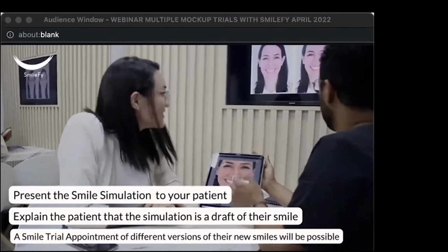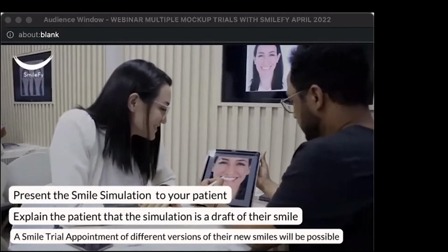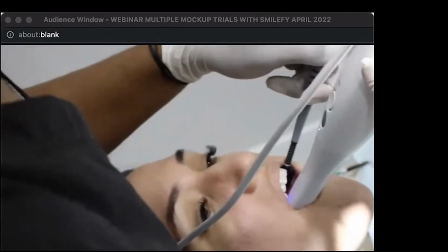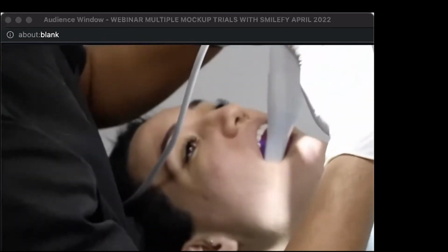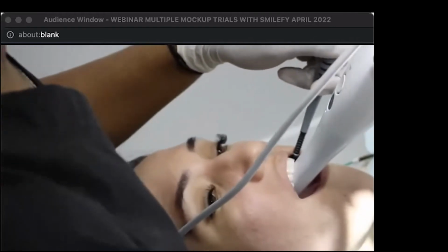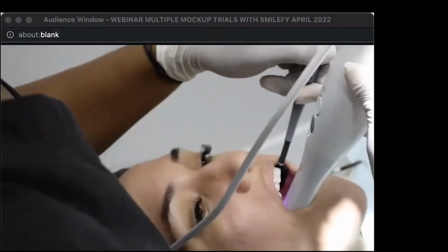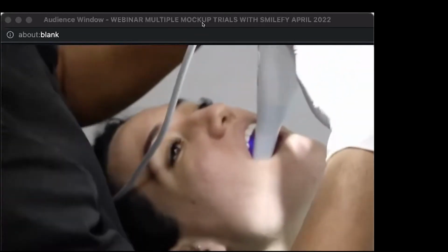And now that my patient is more into knowing about a different treatment option, I can go ahead and add an intraoral scan into my design. In certain cases, you will need to also add a CT scan. It is not mandatory, but if you are planning a gingivectomy case that involves some bone removal, like in this case, for example, then a CT scan is highly recommended.